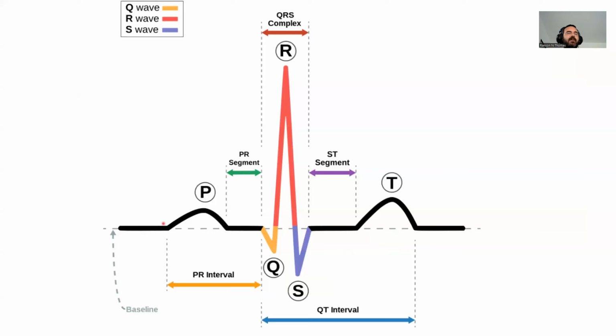As something actually happens in the heart, instead of staying on the isoelectric line, our strip is going to show us different magnitudes, right? So the first thing we should see is a P wave. Now this P wave, as I mentioned before, represents the atria contracting.